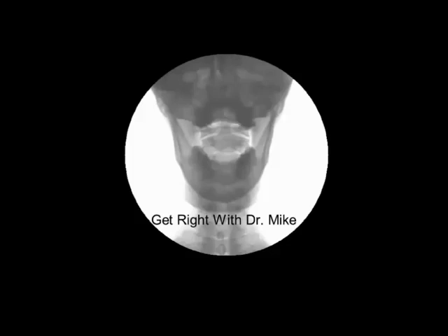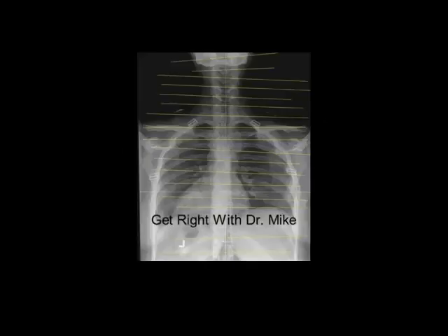So we're going to show you how we put it all together with static x-ray and motion x-ray. The motion x-ray is going to show us the function, and the static x-rays are going to show us the alignment. If we start with this first x-ray, there's going to be some clues as to where the problem's at. So we draw lines on all the vertebra, and we're going to notice from T12 all the way up to about C4, all the vertebrae are pretty lined up and pretty level. And as soon as we get to C3 and C2, there's an immediate kinking to the left. So we want to explore this area to see if there's a problem here.